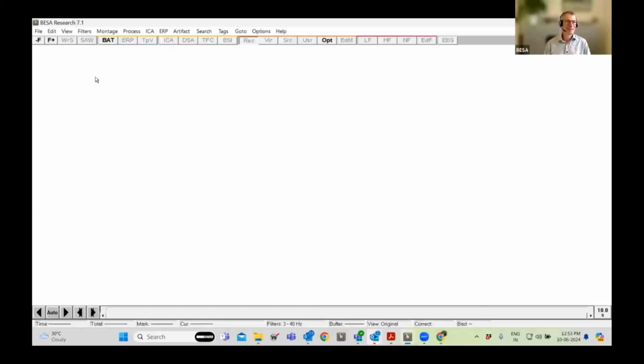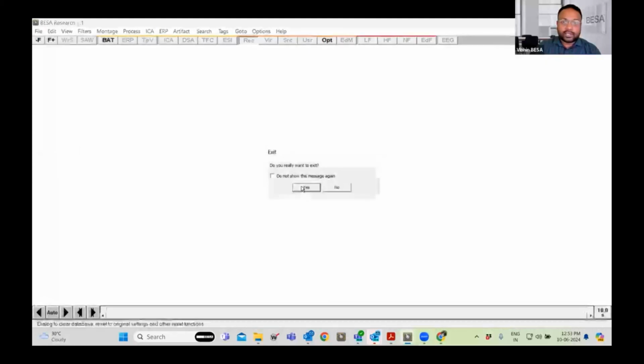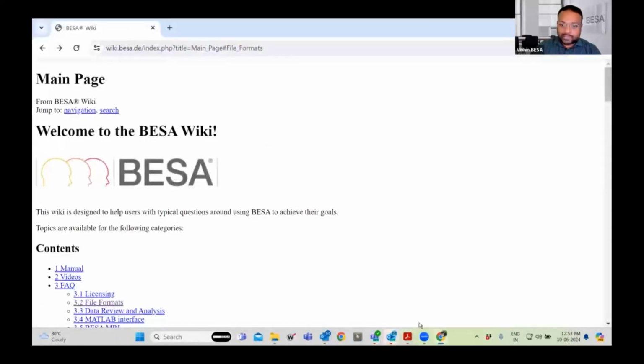Yeah, thank you. So before we start, I just wanted to start from the beginning. When you start it, you will have an icon to start BESA Research, which, when you click start, should first show you which version it is. So just ensure that you have the latest version which has been released.